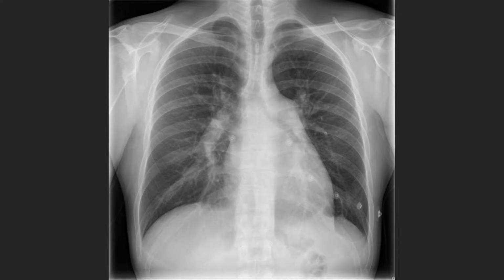What cardiomediastinal contour is abnormal in this case? The ascending aorta looks to be okay. Where is the aortic knob? You may think that this is it, however this is not the case. If you follow the descending aortic stripe from below, you can see that the aortic knob is actually located just above this bump. This is the location of the normal aortic knob. So the question then becomes, what is this bump? This actually represents the main pulmonary artery, and it's way too big.